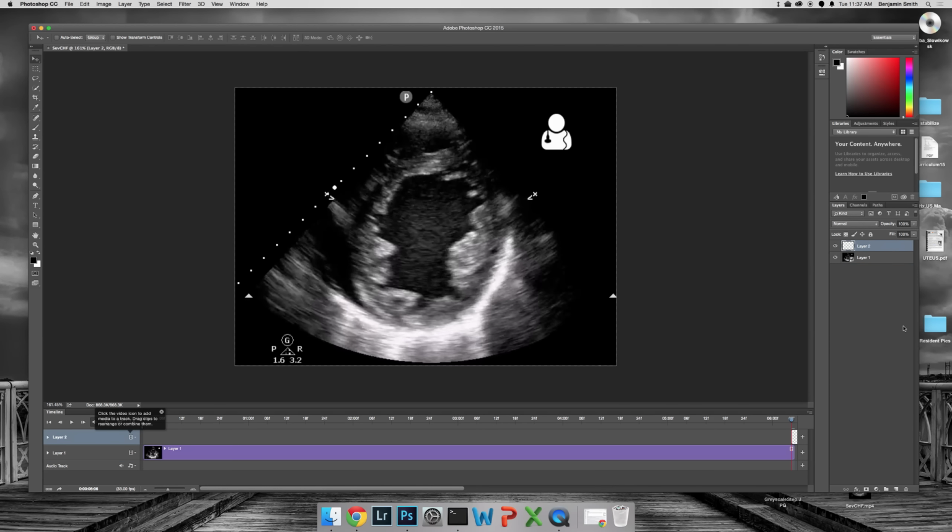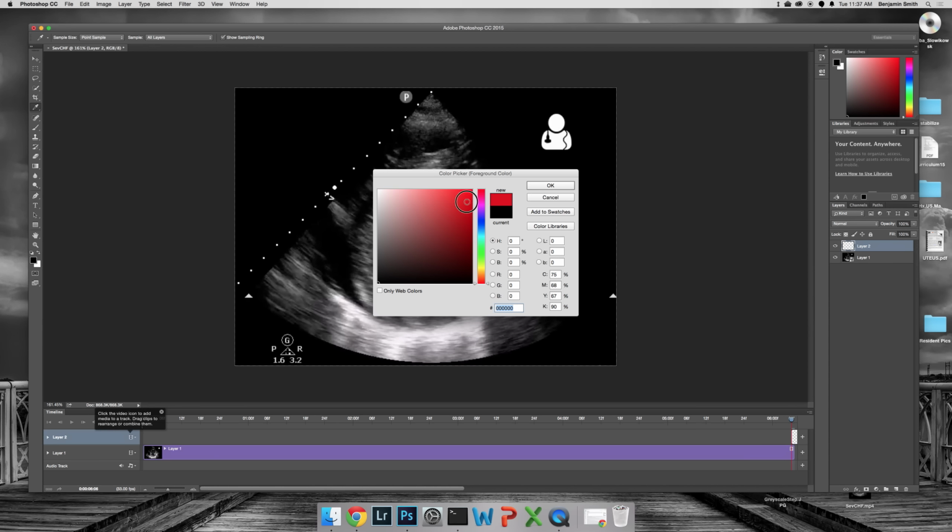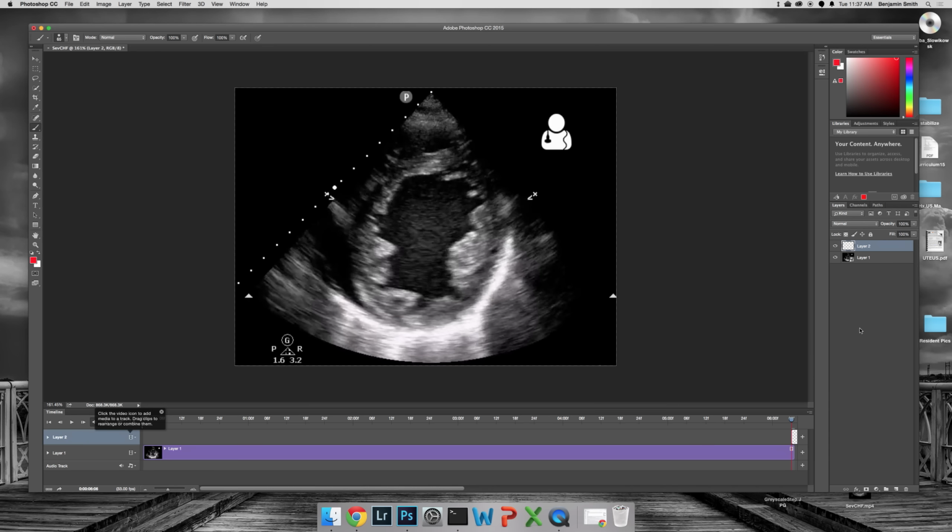So we want to create a new layer on top of that, and let's go to the brush tool by hitting B, and once again we'll increase the size of our brush by right-clicking and then increasing the size. And I'm going to put the hardness somewhere around 50%, so it's kind of got soft edges. Actually I'm going to decrease the size of our brush a little bit, it's a little too big. And select some color here. I'm going to go with this red right here. And we'll change the opacity of our layer to about 50%. And let's just see what happens when I color.